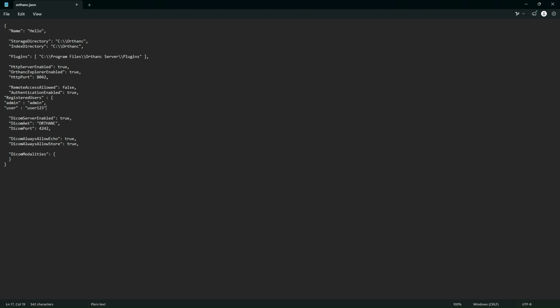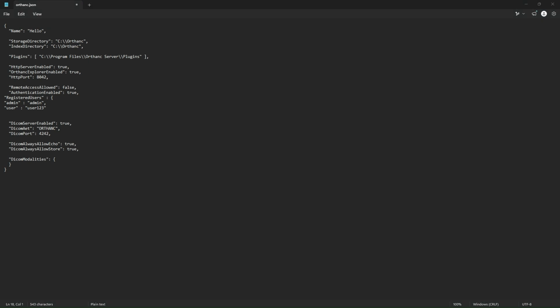Again, after we do that, this is the final piece of this configuration. So here we do not need a comma. Instead, we're going to just press enter, and we're going to add another curly brace right at the end of this configuration. There we go. After we're done with that, we're just simply going to add a comma as this is now complete.